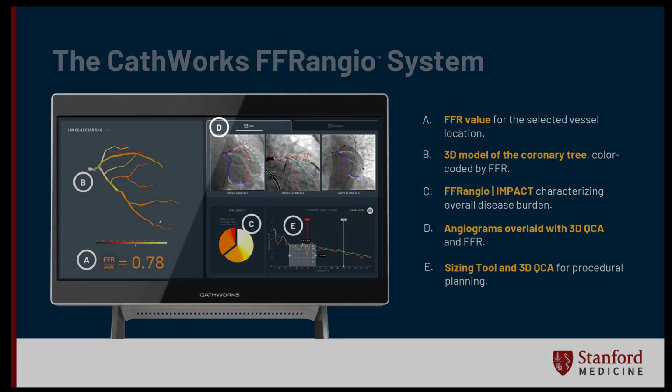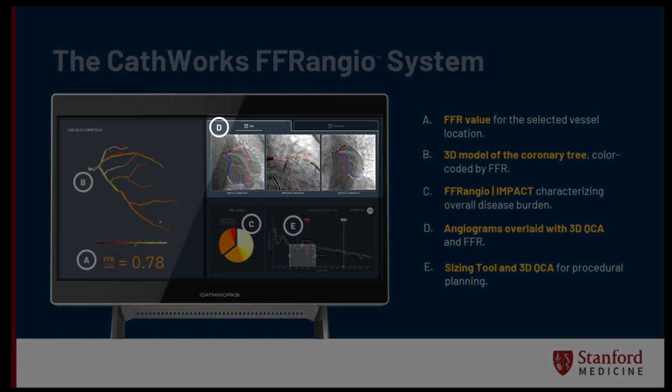Above in those three panels, you have the angiograms, which are overlaid with the QCA and FFR to help you correlate what you're seeing angiographically with what the physiological assessment and output is. It's kind of like an overlay of what you're seeing on your screen routinely with the angiogram.